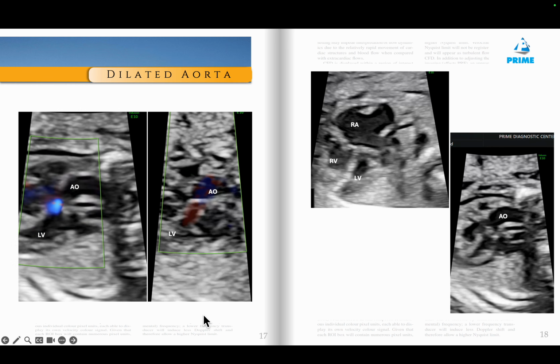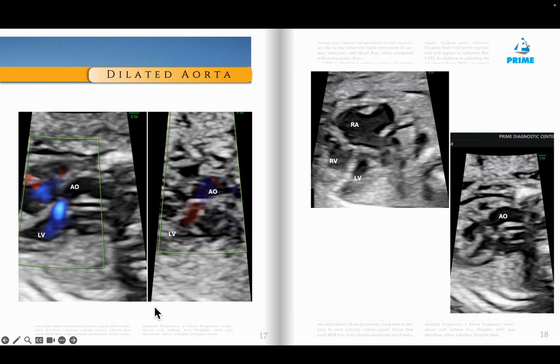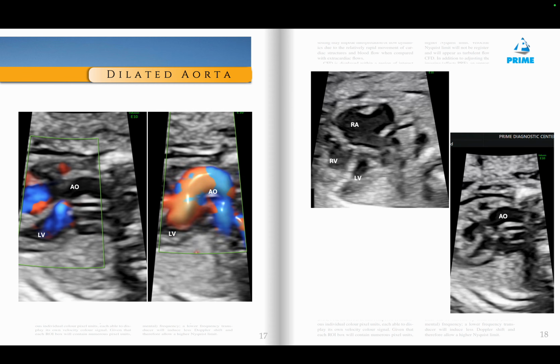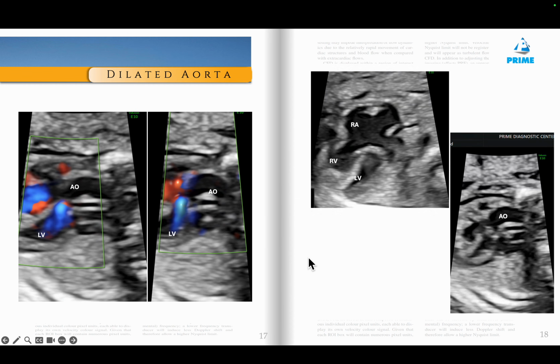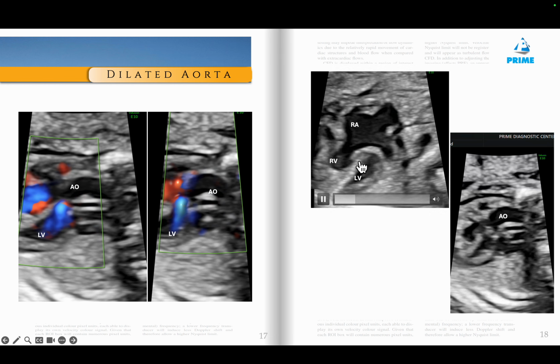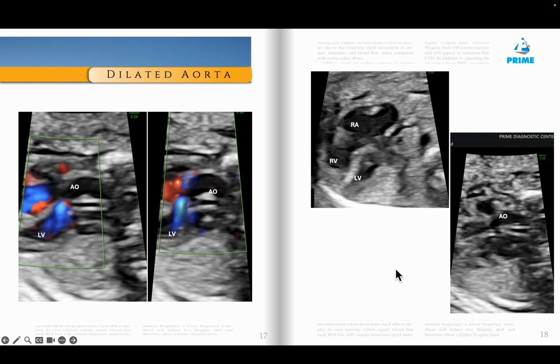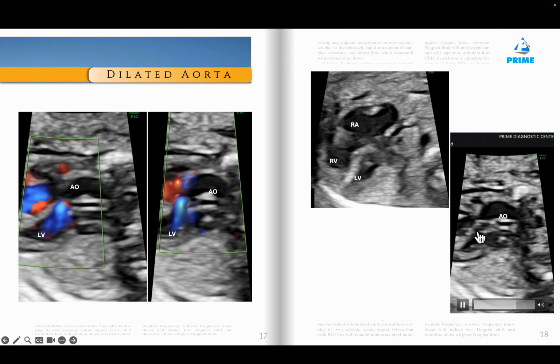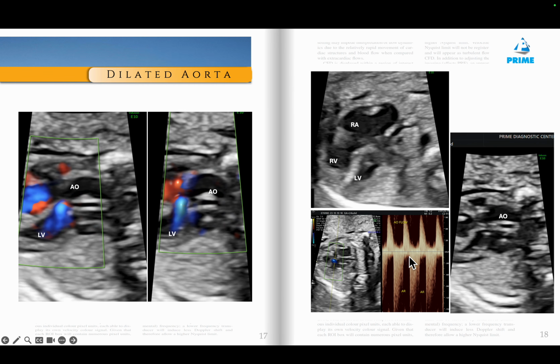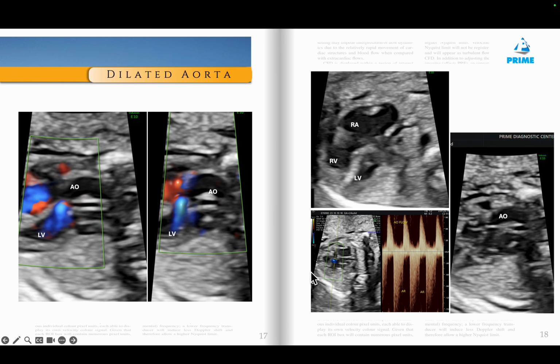So another case of dilatation of the entire aorta, and the reason is aortic regurgitation, and that's moderate to severe aortic regurgitation. This is the valvular aortic regurgitation because of an abnormal aortic valve. So that's a different patient where you see there is a dilatation of the right ventricle and the right atrium, and then you see this is an aorta which is overriding, and there is a dilatation of the aortic root, and that is happening because of aortic regurgitation as well as mild aortic stenosis.